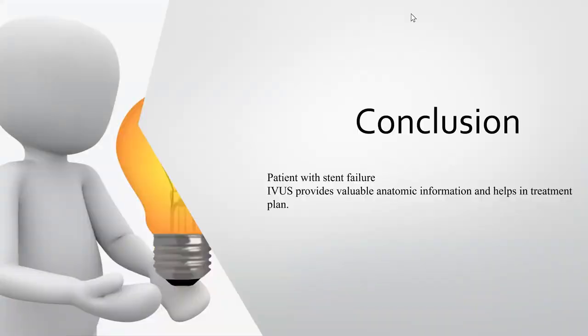So concluding this case, in a patient with stent failure, IVUS provided valuable information and helped in the treatment plan.